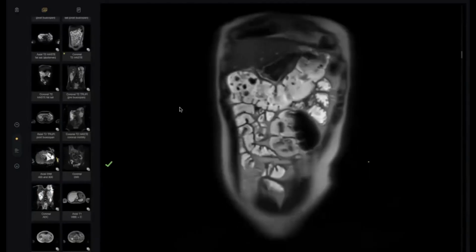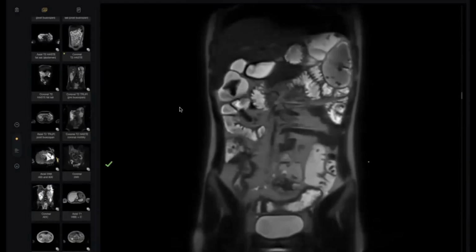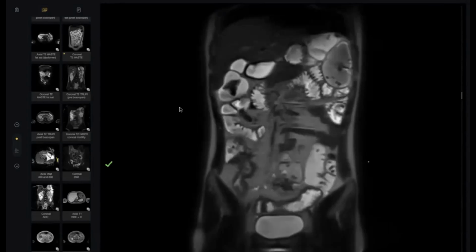So give me a conclusion, please. Findings are suggestive of active phase of fibrostenotic Crohn disease. I think there is also fatty proliferation in the mesentery with multiple skip lesions. So I will refer the patient to the gastroenterology team.